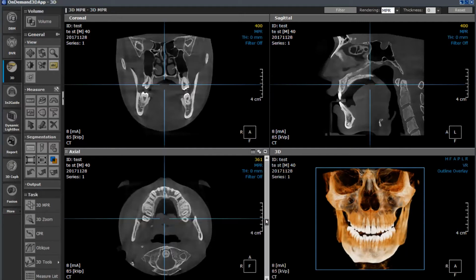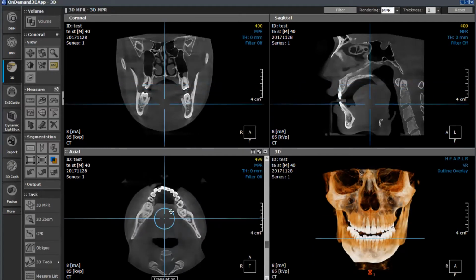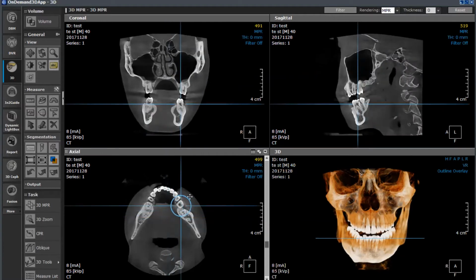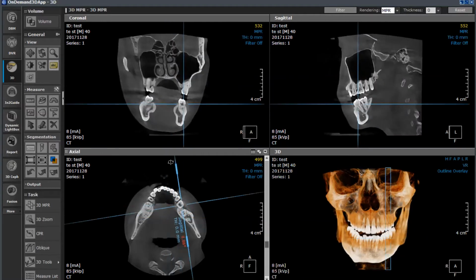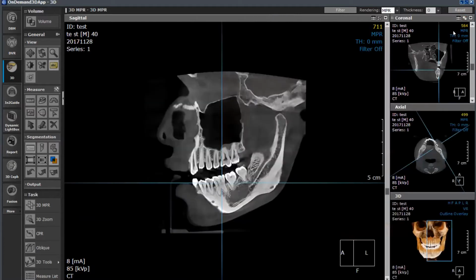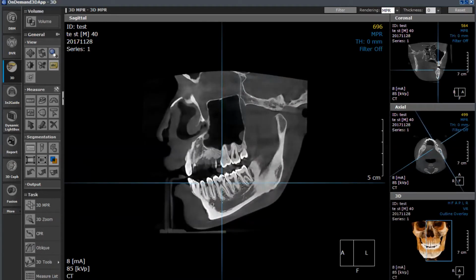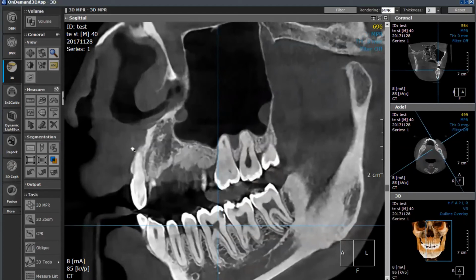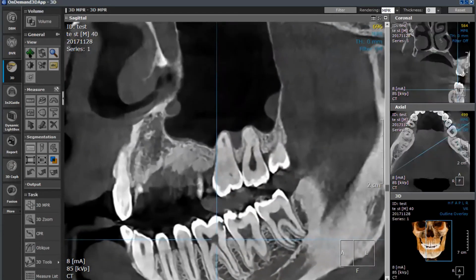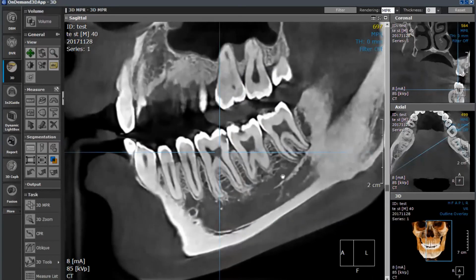So now again, when I come down over here, I'm going to look down at the mandible. I'm going to go over and look at this tooth and create that same buccolingual view. So now I'm going to go ahead and blow that up. And we're going to get to that tooth that has the central cavity in it right there. So I'm going to blow that up for everyone to see. And I'll center it. All right, so now we're at that central cavity right here.